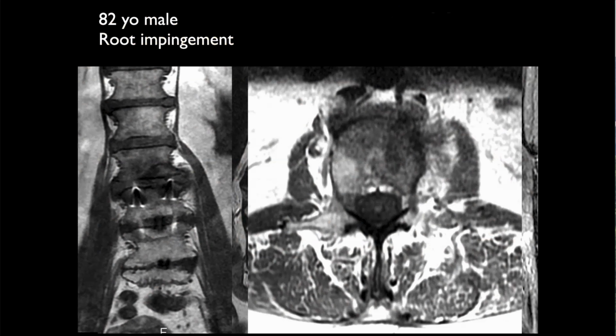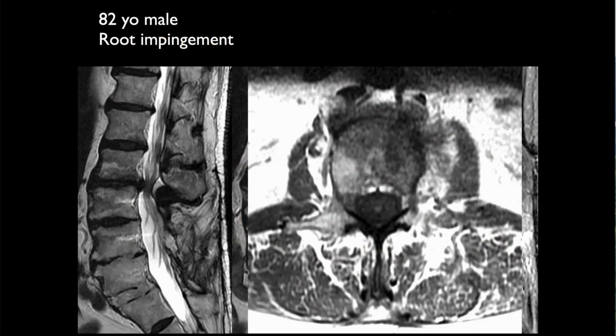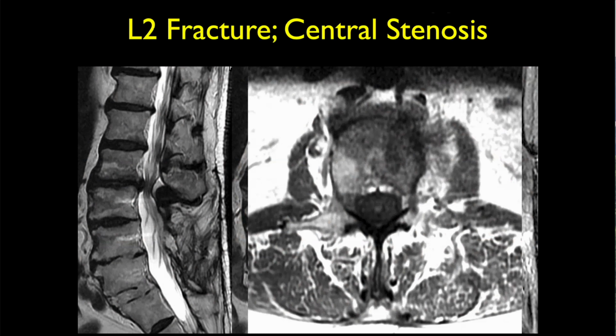I'm not sure. Let's see. Is there a fracture line in that vertebral body on the left there? Yeah. Sagittal, yeah. I'm not sure. I think I'm seeing some central stenosis here. Yeah. Good.